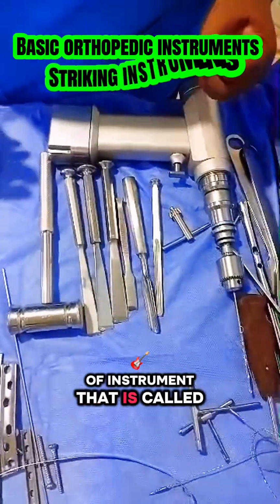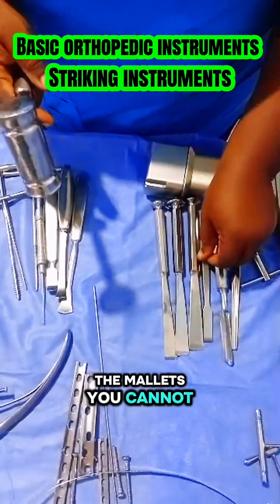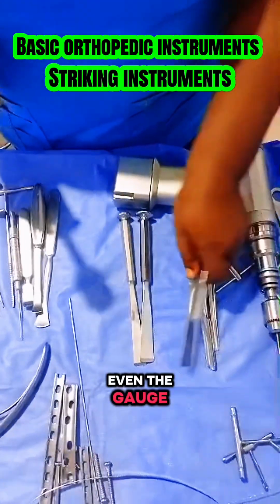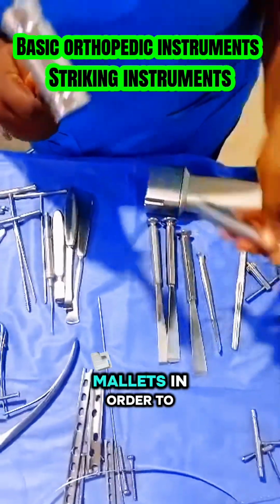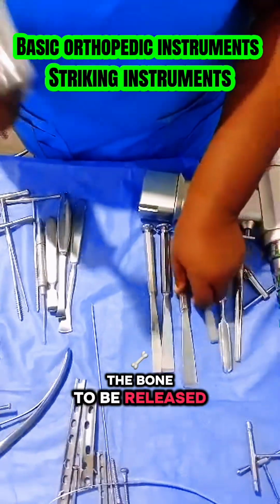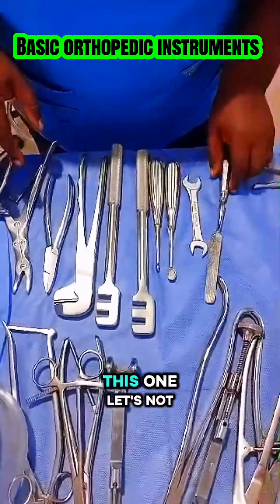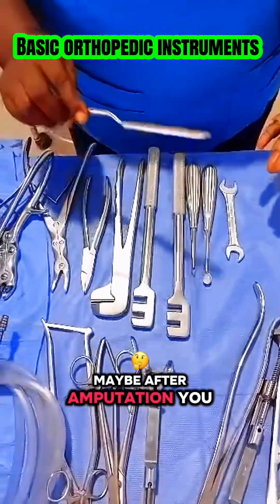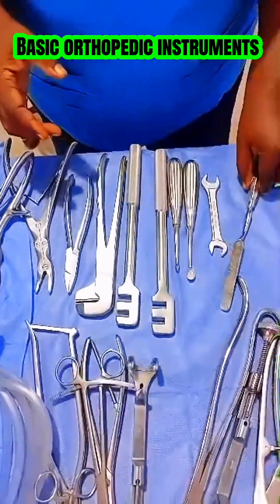Another group of instruments is called striking instruments. One of them is the mallet. You cannot use the osteotome or the chisel, even the gouge, like that. So you use the mallet in order to strike for the bone to be released. So these are striking instruments. I've not mentioned this one. Let's not forget our bone file. Maybe after amputation you want to make the bone smooth, so you need to use the bone file. That's what it's used for.